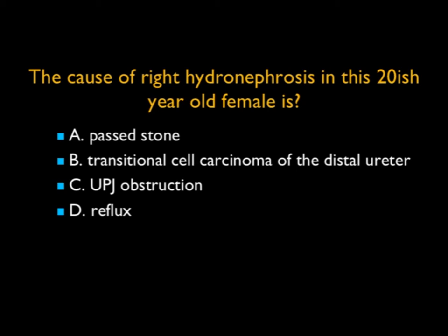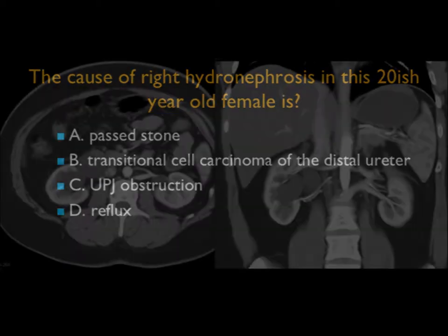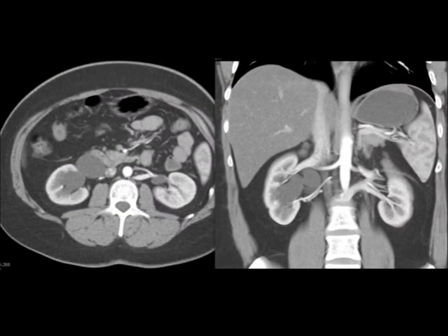Patient has right hydronephrosis. Why? Well, you look at the kidneys, a dilated renal pelvis, dilated collecting system, but you can see where the UPJ is. Now, obviously, I have delayed phase imaging, and I can give you more imaging, but you can see here the patient has 2 right renal arteries. Oh, yes, there's a circumaortic left renal vein, but it's the lower renal artery which cuts right across the pelvis.